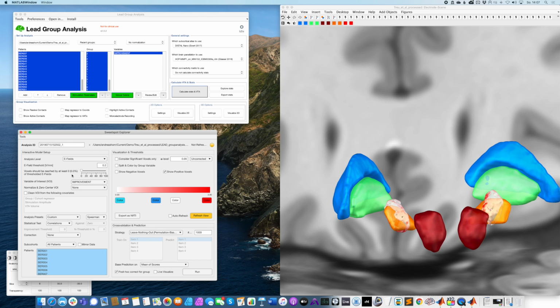But you are the researcher. You have to think about what is good for your analysis, what your hypotheses are. So, as in all these tools, unfortunately, we cannot really tell you what the best setting is. That's why we enter these sliders if we are unsure what is best ourselves. Okay, let's go back to VTAs here. Let's say at least 20%. In this case, 10 VTAs should fill a certain voxel to be considered.